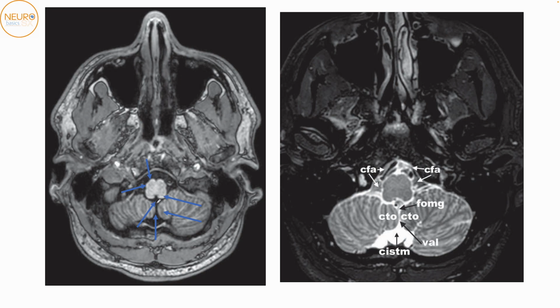This is the foramen magendie. These are cerebellar tonsils located medially. Okay, and this is the space between the cerebellar tonsils known as the vallecula. That is the vallecula. This is the space through which we carry out the telovelotonsillar approach.